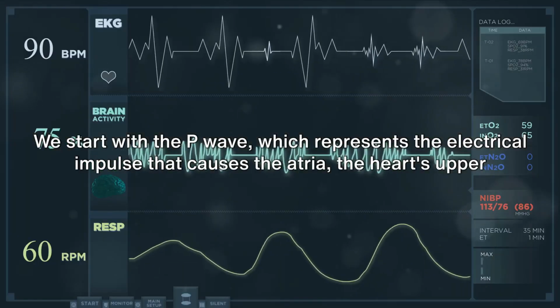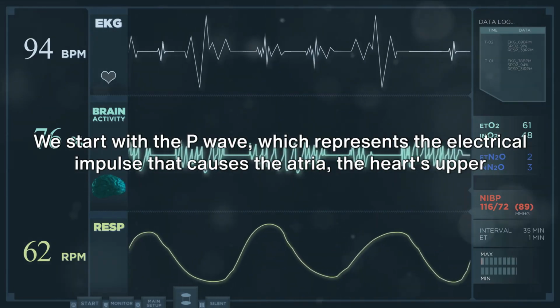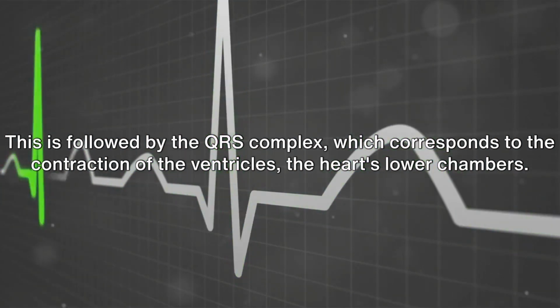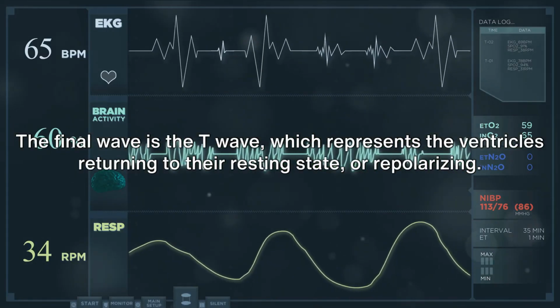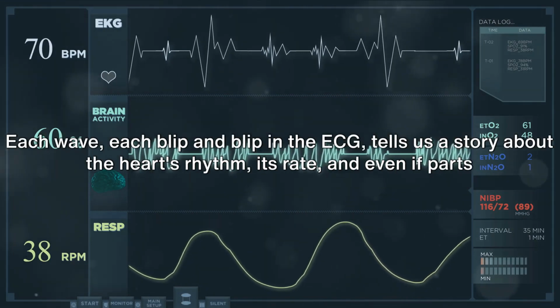We start with the P wave, which represents the electrical impulse that causes the atria, the heart's upper chambers, to contract. This is followed by the QRS complex, which corresponds to the contraction of the ventricles, the heart's lower chambers. The final wave is the T wave, which represents the ventricles returning to their resting state, or repolarizing.